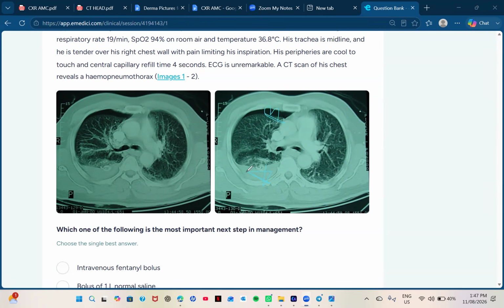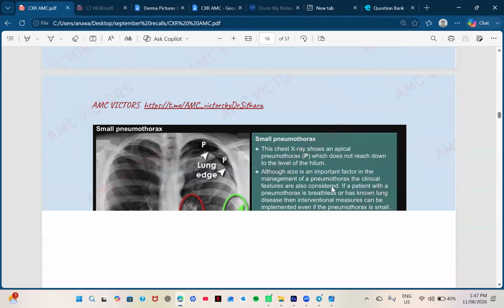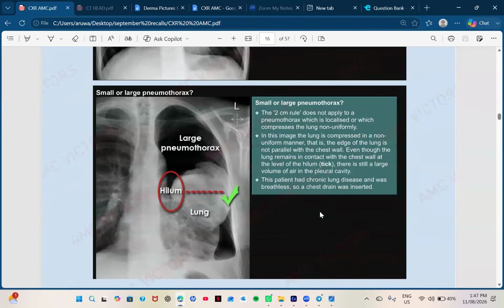Okay, hemothorax at the bottom right, and the pneumothorax here, like black color, right? I told you that they also appear black color. You can see the air, right? The fluid and everything in here, dense, you can see like this. It's a better question. Okay, so yeah, just for your knowledge, because these are very important. Okay, so yeah, quickly go through. I have attached extra material, then yeah, you all know how to understand it.